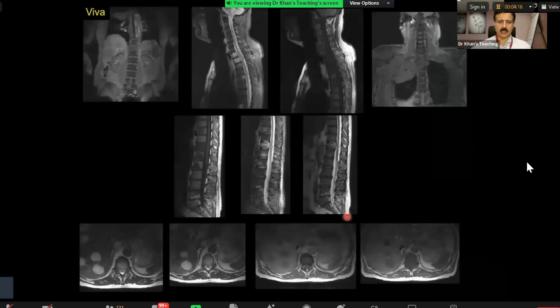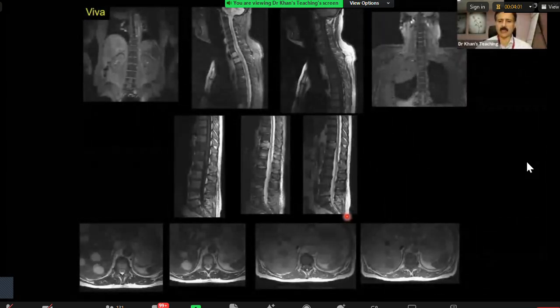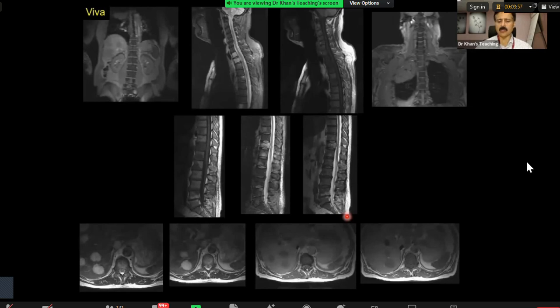That's fine. This is a case which we will skip, but just to make a point, in the exam, these kinds of cases can come where multiple findings are visible on the available sequences to make a conclusive type of diagnosis. If I don't show you other sequences, for example, here you will say low signal on T1, high on STIR, multifocal. So this is in keeping with metastasis.